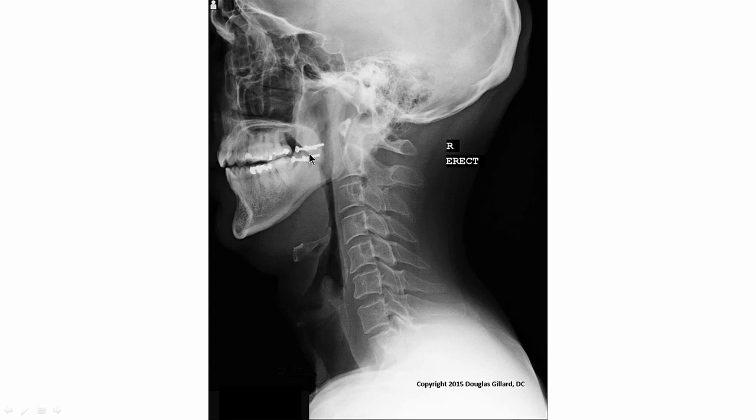What are these things right here? This patient had a fractured jaw bilaterally, right? Two sets of screws on each one. Actually, it was dental work done. They wanted to shorten the jaw to improve his bite, so they fractured it.